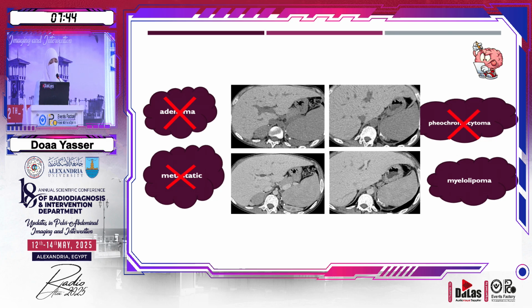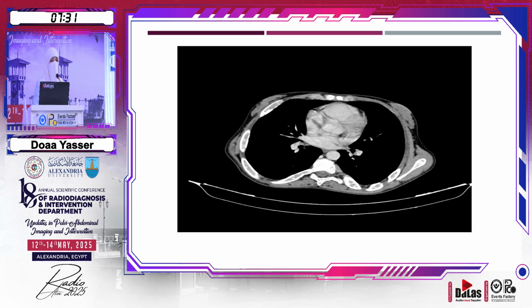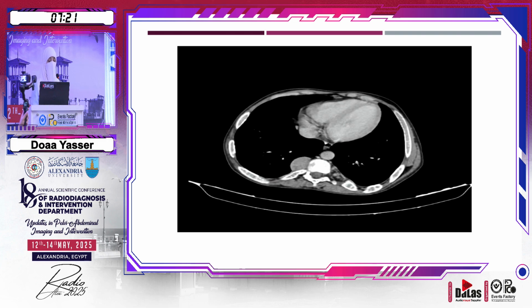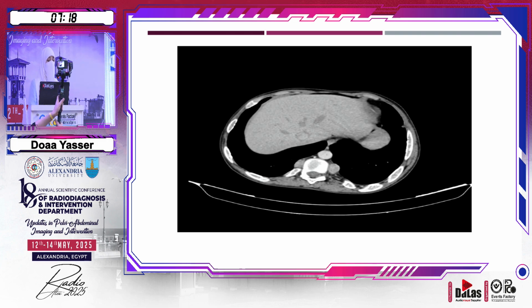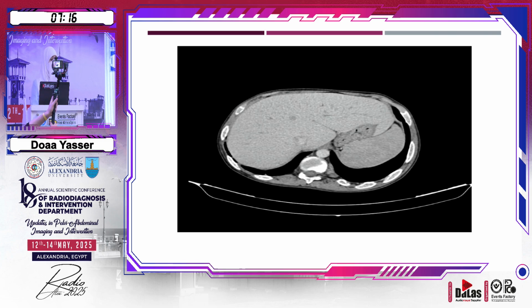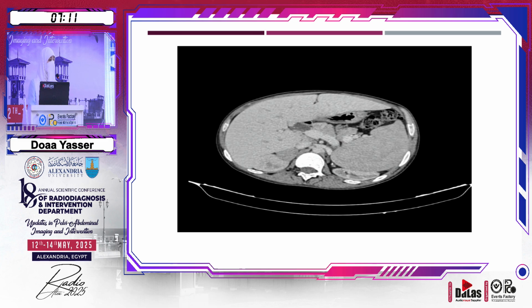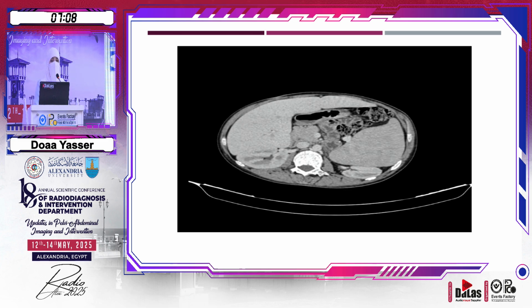Myelolipoma could be accepted for the left adrenal lesion for the gross fat attenuation. Still, it does not explain the larger right adrenal lesion, so we need another clue. Let's have a deeper look at the CT venous phase, and this time I want you to focus upon the basal chest cuts. Yes, here we have bilateral paravertebral enhancing soft tissue masses reflecting the typical site of extramedullary hematopoiesis in thalassaemic patients.